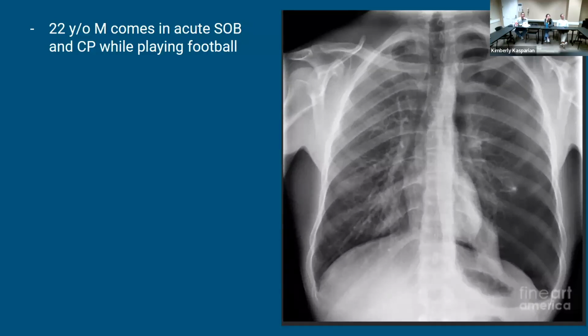So his airway, maybe a little bit to the right side, but not too bad. Bones, don't see anything that stands out abnormal there. Cardiac silhouette is fine, not too big. And part of everything, diaphragm, there's no effusions here.